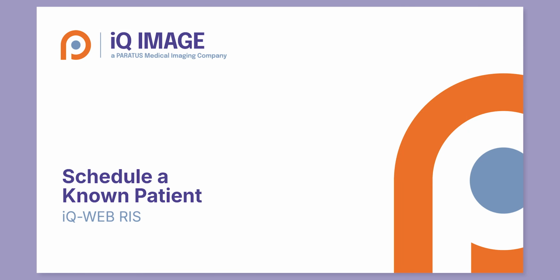Welcome to a short tutorial on how to schedule a known patient in iQ-WORKFLOW. As front desk staff, I want to schedule a known patient so that I connect previous patient and study data to the new request.